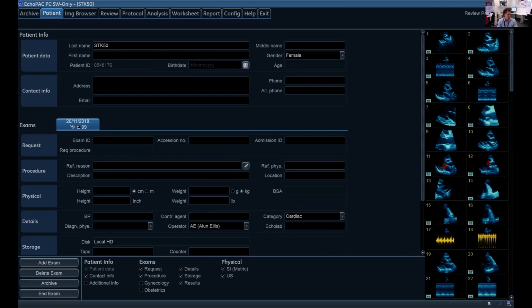Okay, so on 2D imaging for tamponade, this is a pretty obvious statement, but you would expect to see a pericardial effusion. And the size of the effusion may not necessarily correlate with the likelihood of tamponade, because a slowly accumulating effusion can become quite large before causing tamponade. Beautiful comment, yeah.